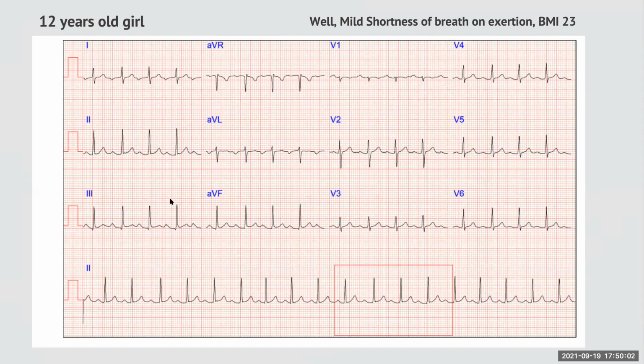Ask any GPs, especially the pediatric guys. Usually the AV node is very slick in somebody who is 12 years old, so it's rare to see this. It almost comes down to a first degree heart block, and this ECG is actually being reported as first degree heart block, nothing else.